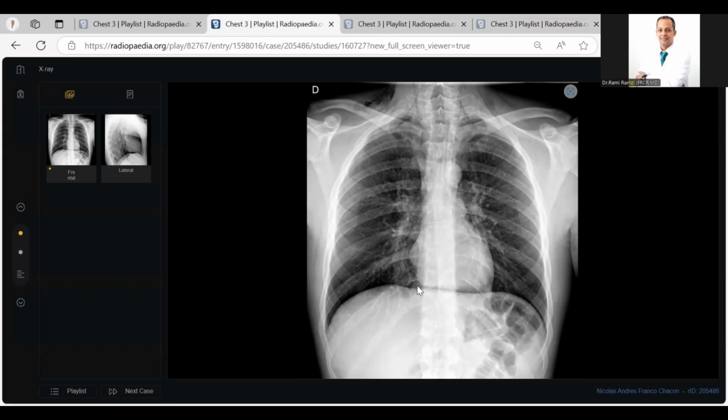Because I ask you, this is a case of acute chest pain. There is a continuous diaphragm sign, and there are multiple bilateral streaks in the neck, curvilinear and linear radiolucency. And there is subcutaneous emphysema. You didn't mention it. No, sir, I mentioned subcutaneous. So I'm dealing with a case of pneumomediastinum. My differential diagnosis includes one, two, three.